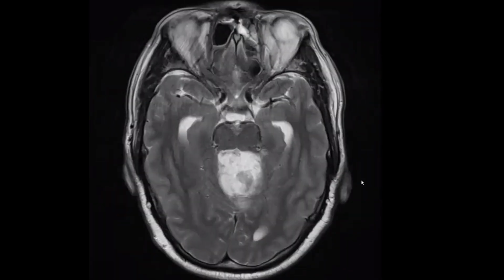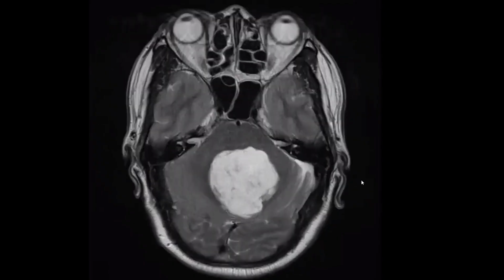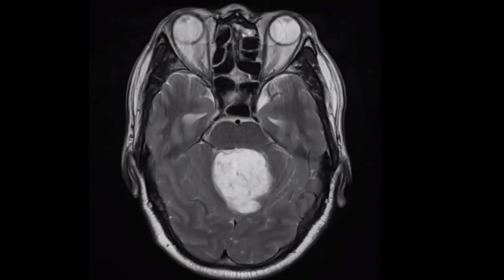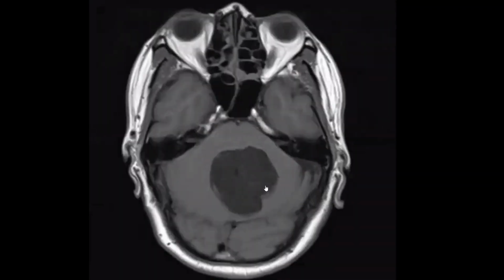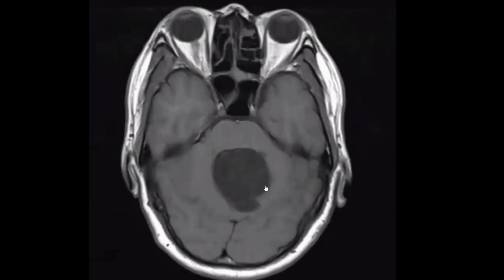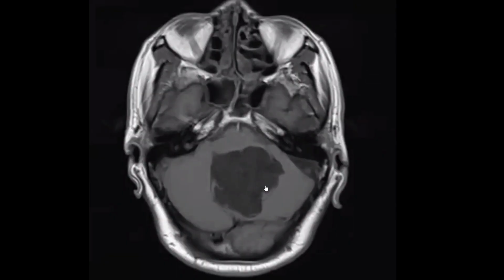Up to these images I can give differentials. It could represent epidermoid or arachnoid cyst. However, as this is an emergency, as the patient is developing hydrocephalus, I will pick up my phone and inform the referring physician. Very nice. I will refer to the neurosurgeon for VP shunting.